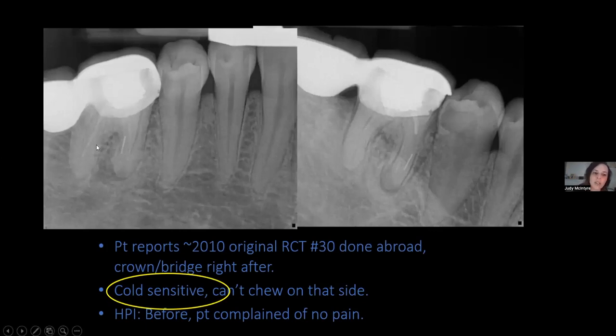And again, this is why I'm begging you guys to take better, more diagnostic films, because these angled films aren't helpful. The foreshortened films aren't very helpful. Again, maybe a periapical lucency here, and maybe there's a J-shaped lesion here. To be very honest, I'm not sure exactly what the referring dentist saw, because the only thing on my referral pad was retreat, right? But I'm suspicious of a J-shaped lesion. Hopefully you would be too, and I'm going to walk you through my thought processes on J-shaped lesions.